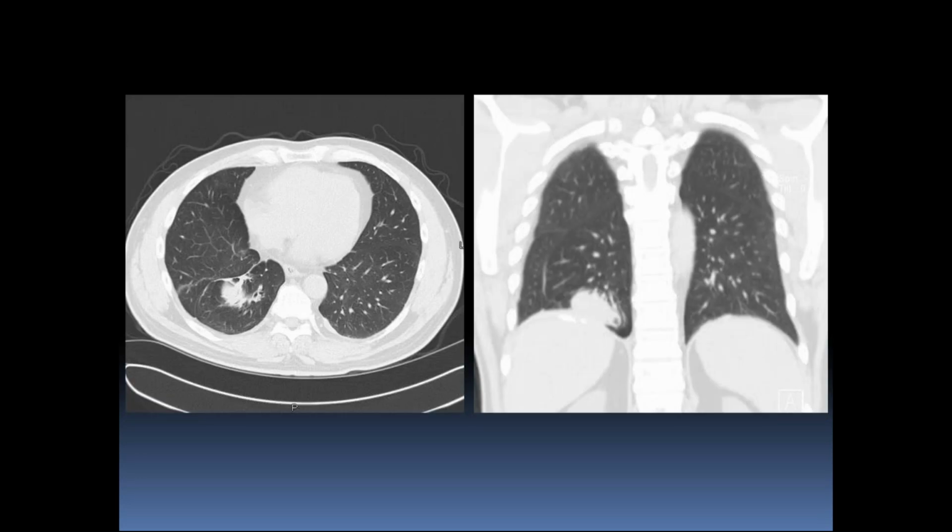So here is one of the later stages in the pleural disease, and this is the round atelectasis. Now, some people would think that this is a mass. I can't fault you for that, but this is pretty much a slam dunk case of round atelectasis. Look at what it's doing. Bronchogenic carcinoma or secondary metastasis don't do what this is doing.